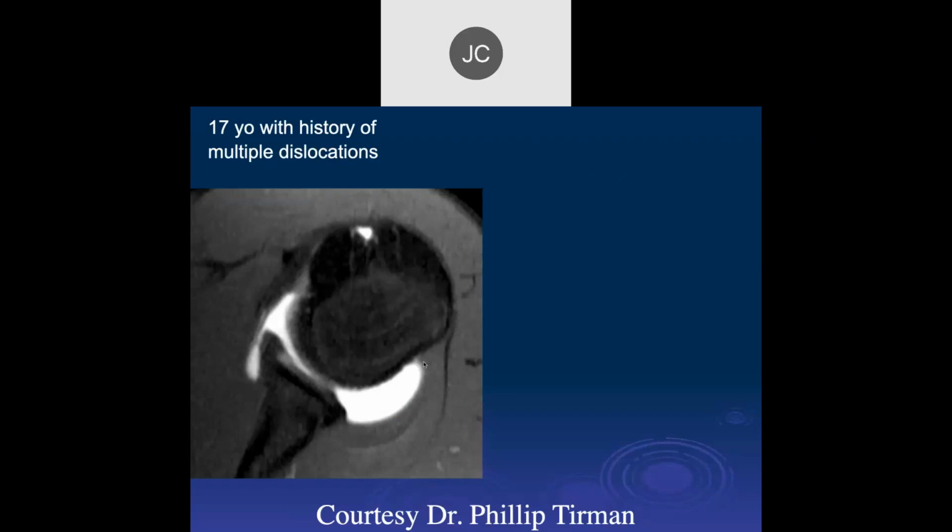Okay, 17-year-old, multiple dislocations. There's irregularity of the posterior labrum. Looks like maybe it's dislocated medially, maybe. You're talking about this? Yeah, I mean, posteriorly. Okay, and then what do you think of the anterior labrum? I think it looks fine.